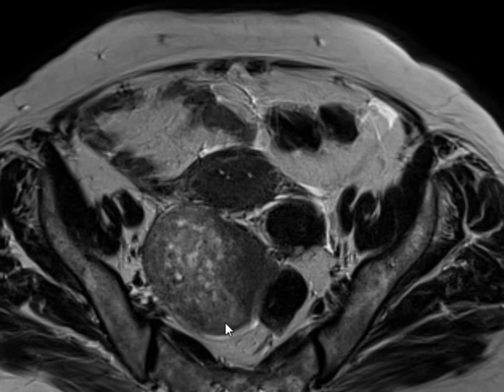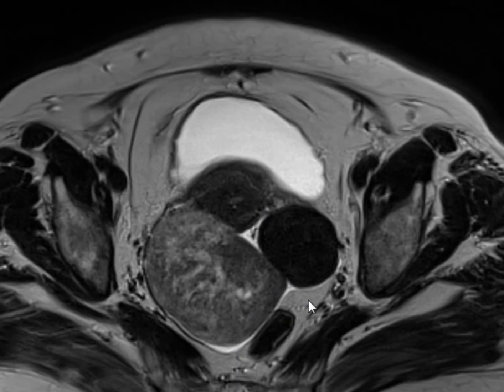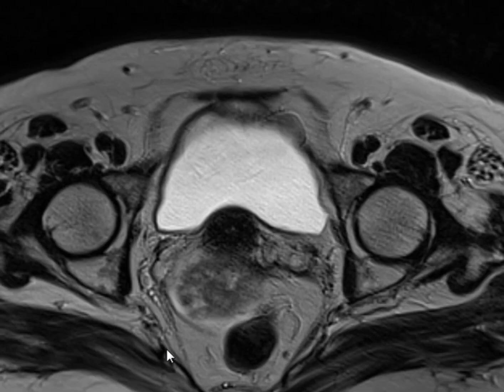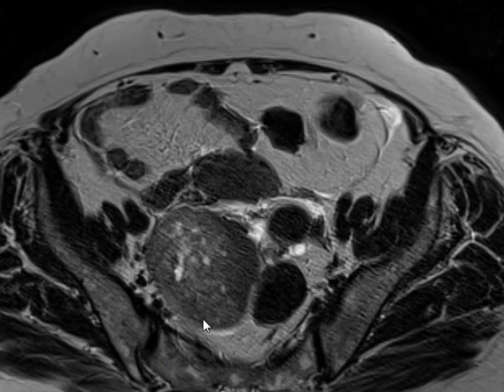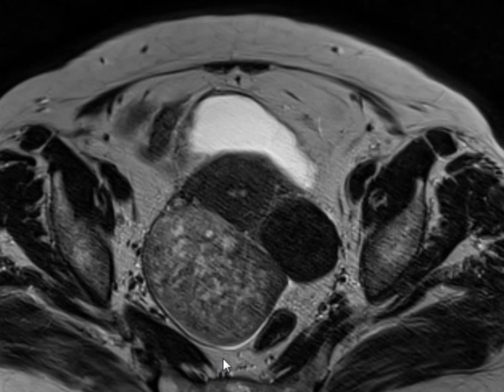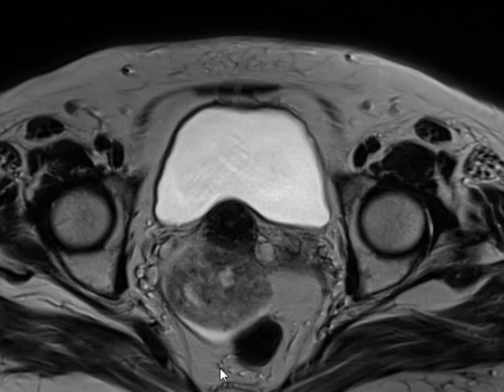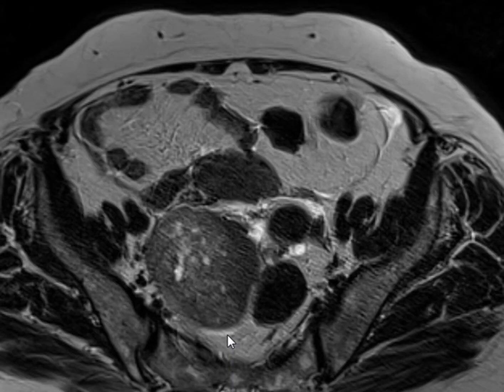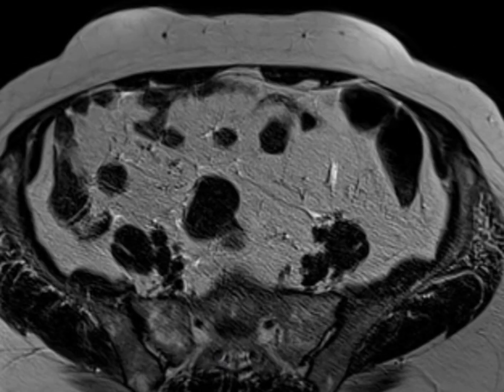What else? Is there pelvic free fluid? Some free fluid. Good. Any lymph nodes? No, I don't see anything. You have to speak that. There is no pelvic lymphadenopathy. What about the urinary bladder? Does it look normal or abnormal? If abnormal, why? Normal. What about the uterus? In this section, normal uterus. Normal bladder. Good. Come on. Let's see the coronal first.